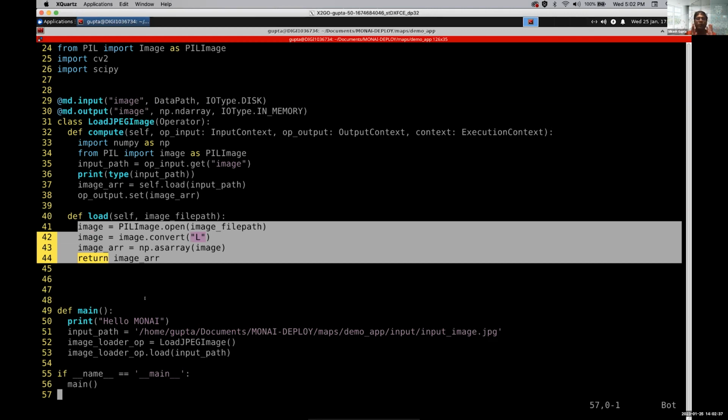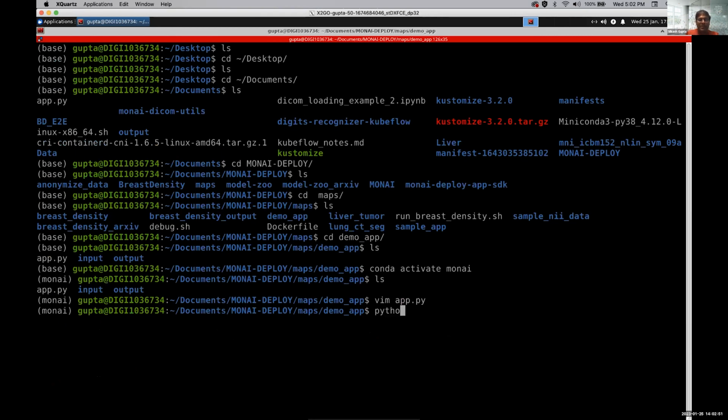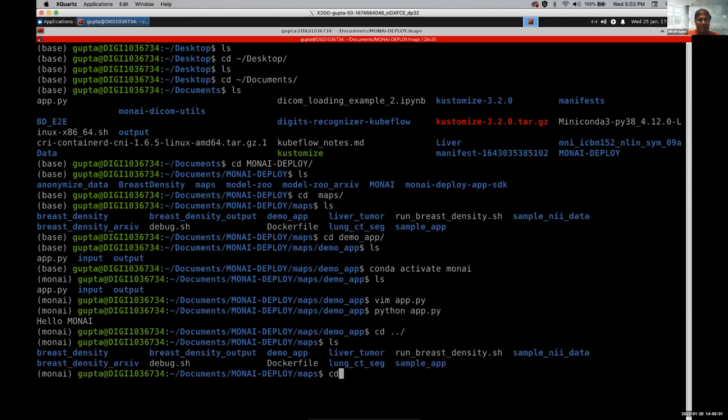What I'm trying to say is that whenever you hear maps, if you have an old application, not necessarily deep learning related, you can still use it. No worries. Let me see if it works actually. Oh yeah, it works. So it's great. But let me just show you something more.